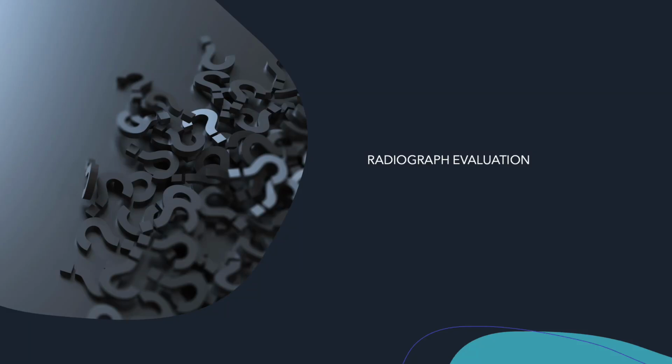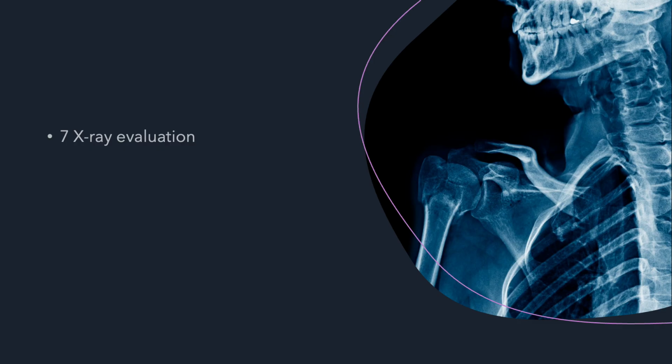Good morning. Let us touch on the basic radiographic evaluation of bone lesions. We have our usual 7 X-ray questions or evaluations. This is usually used to help the clinician have an initial evaluation of the bone tumor. It is not applicable to soft tissue lesions. This will give us the answer on the aggressiveness of the lesion and not the diagnosis.